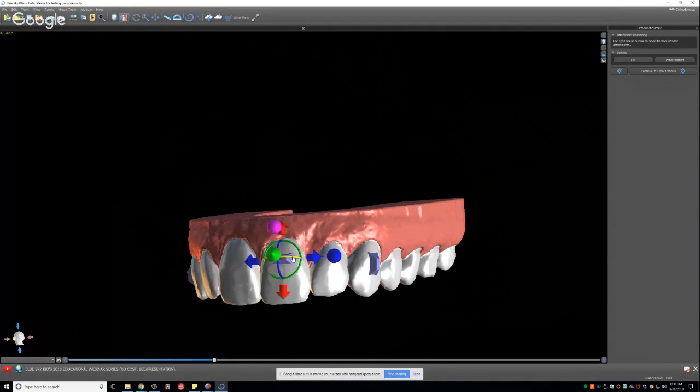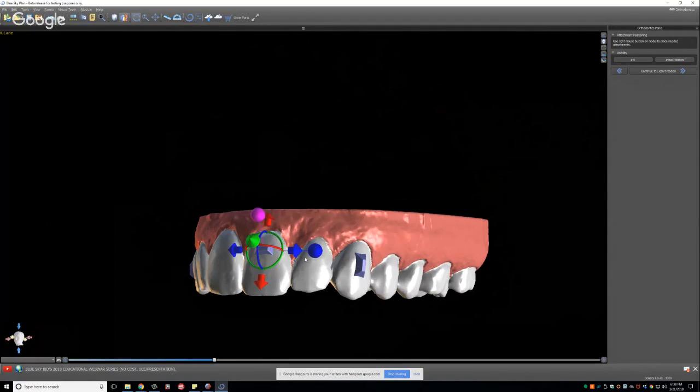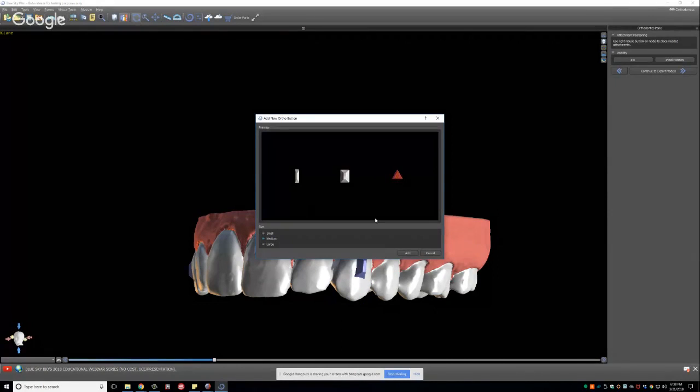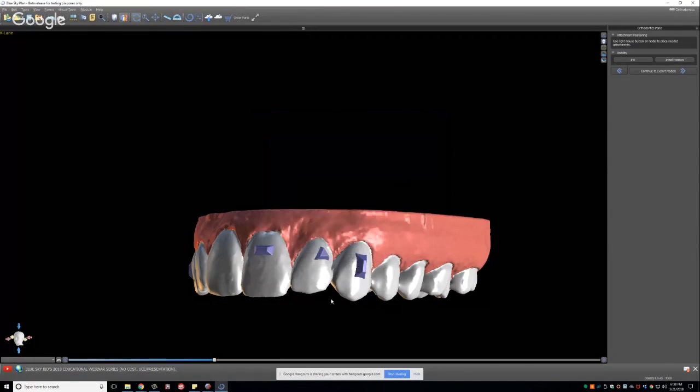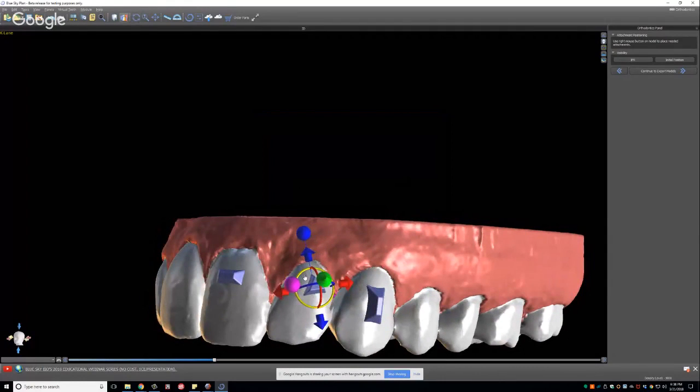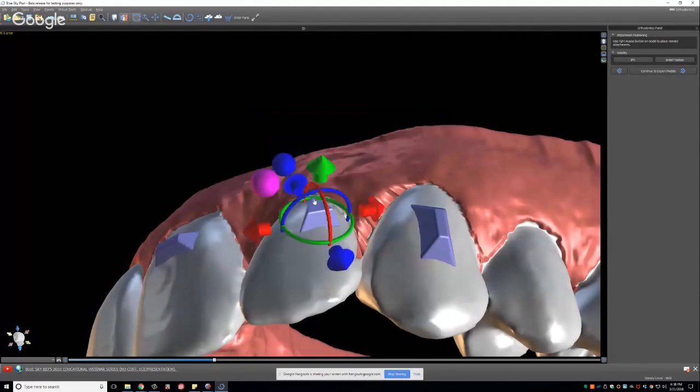And the last thing is going to be for this lateral incisor. Now, you can use the triangular buttons for this, and that's what I have done in the past, but I will be transitioning to the more sliced elliptical button that we will be adding very soon.